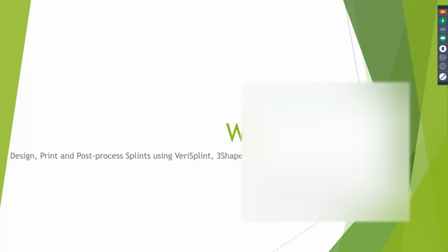Again, take it out. It's going to have a yellowish green shade to it. Pumice, polish, let it sit for a few days if you have the time. Otherwise, just give it to the patient and let them know, hey, just wait a few days, it's going to clear up. And that discoloring will subside, just like the Uvatron.